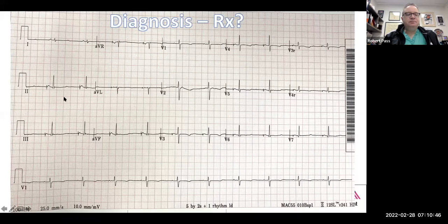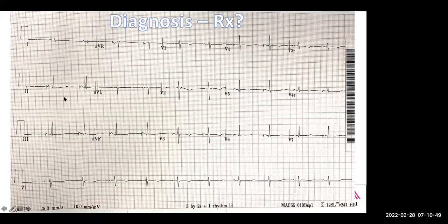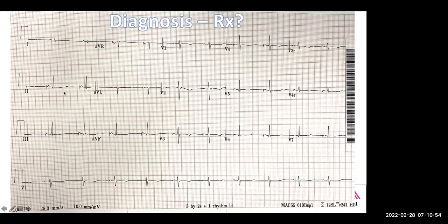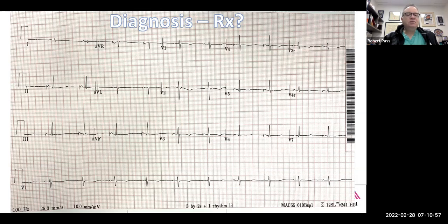When you're trying to make the diagnosis of long QT syndrome, which this patient does have, you also want to look at the morphology of the T waves and the QT interval. And this is a very, very abnormal appearing QRST segment, right? You have this very long isoelectric period with this very late peaking T wave. In lead 1, it's pretty obviously strange and unusual looking. If we look in lead F and in 3, we almost can't see where the T wave ends, it could end all the way out here potentially.